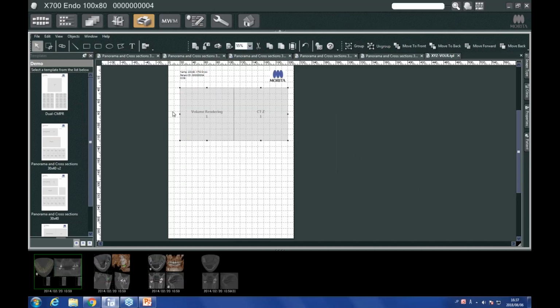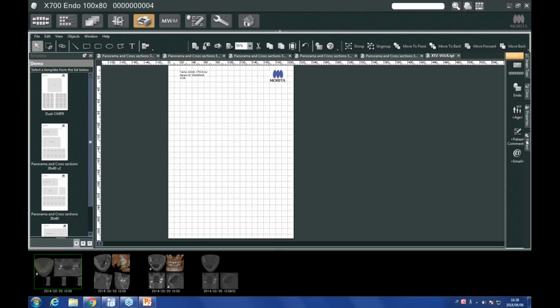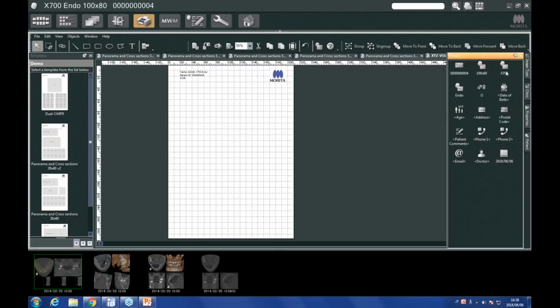Now, since this presentation is a little bit on how we actually use i-Dixel, I wanted to show very briefly how I would create a template like this. We're not going to go into deep details. This is just very roughly how I would lay it out. So on the right side of the screen here, we have several different panels. Patient data, which is all of the patient information. This will be filled in depending on the patient that you've selected.